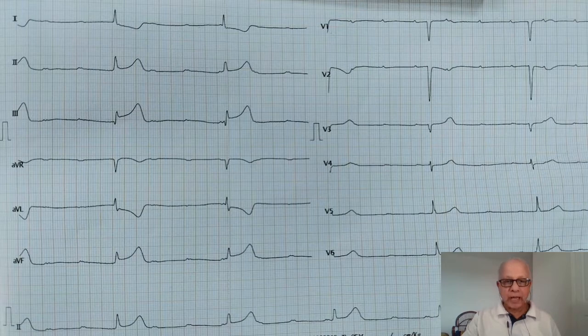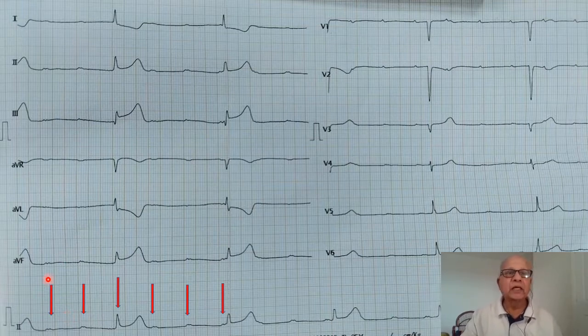So we will go on to the answers for this quiz. So we'll discuss this ECG. Now what is the striking feature here? It is the slow but very regular heart rate, isn't it? Very slow rate, but it is regular. The P waves are seen in lead 2 and V1. You can see it in other leads also, but I think it's seen better in V1 here. And of course lead 2 is also seen, and they are occurring at a rate of 100 per minute. 3 large squares which I have measured already. So the rate will be 100 per minute, 300 by 3, right?